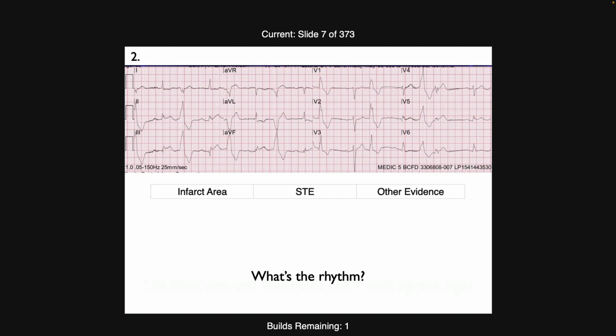And then something goofy happens here. I'm not quite sure what. So you can see, here's the sinus beat, here's the PVC, sinus, PVC, and so forth. Okay, everybody see that? You wouldn't have any trouble if we were doing this in the fall, and I just gave you a strip, every one of you would get that, okay? Now, actually, it doesn't show here.